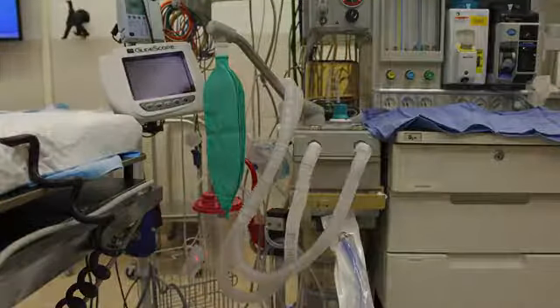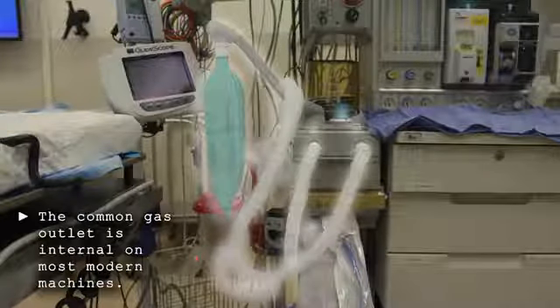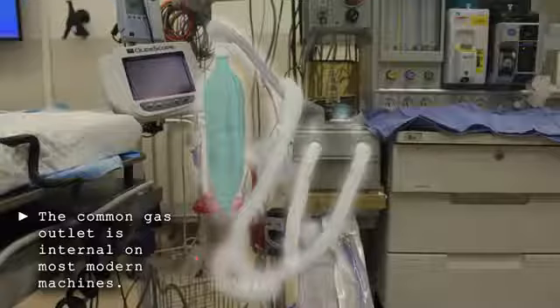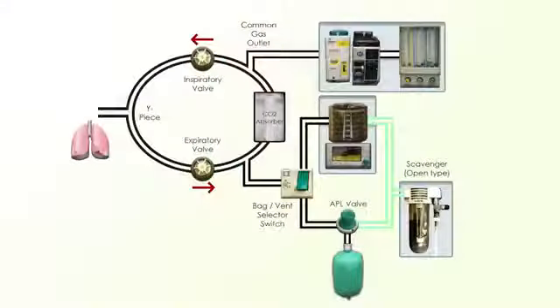Next, the fresh gas flow and any added volatile anesthetic flow to the common gas outlet, which feeds into the breathing circuit. The basic functions of the breathing circuit are to deliver the gas and volatile agent to the patient without allowing for the rebreathing of exhaled carbon dioxide, and to allow for positive pressure ventilation.